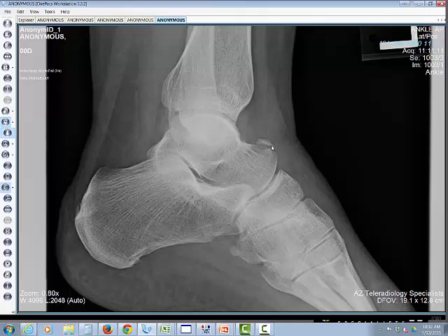Again, just to reiterate, of course, we see this curvilinear, jagged shape, unlike the accessory ossification, which we can see here as an example. See how rounded and well defined that is. That's very typical for an accessory bone. In this case, it's an os peroneum.